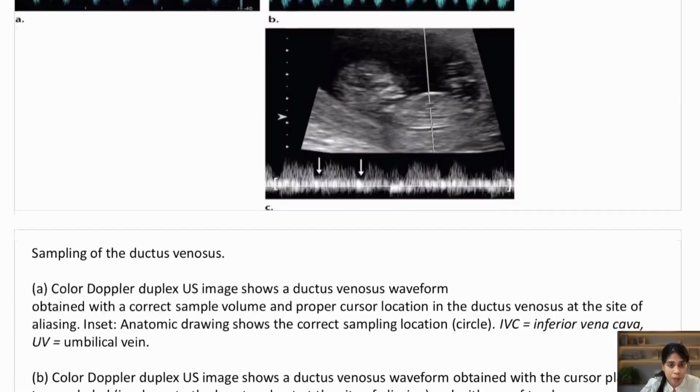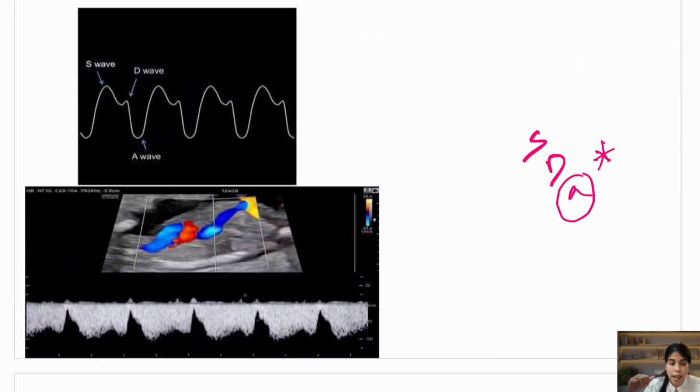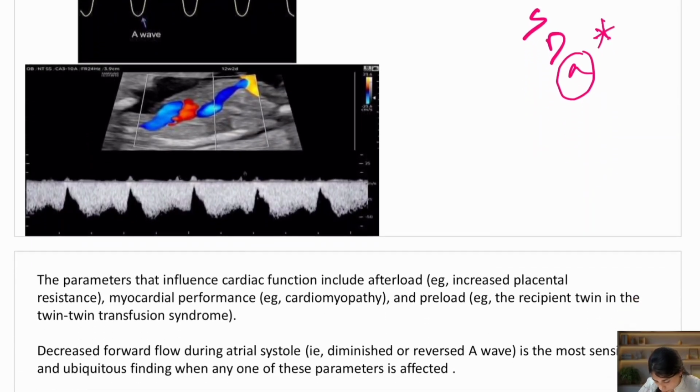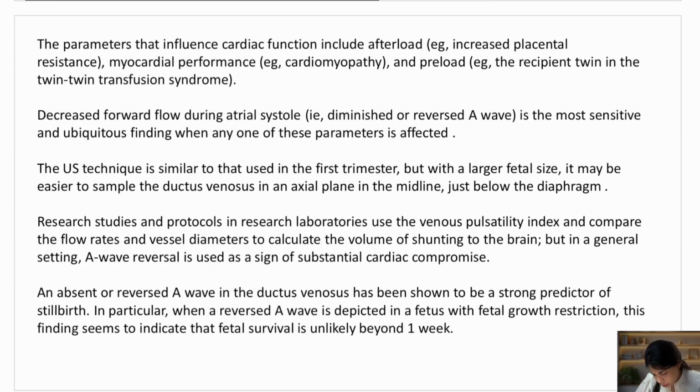So, in the first trimester, this is the role of ductus venosus for aneuploidy and for congenital heart diseases. For heart diseases, fetal echo should be done, and for aneuploidy, there should be some other soft markers also: NT, NB, tricuspid regurgitation. So, all these should be measured. Okay. So this absence or reversal of A wave should be taken seriously.